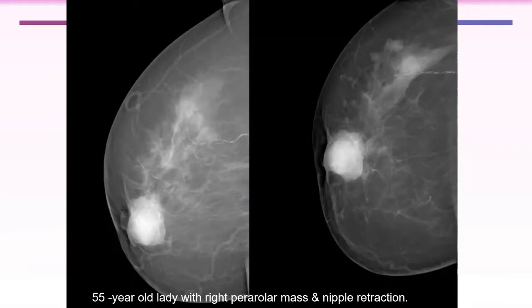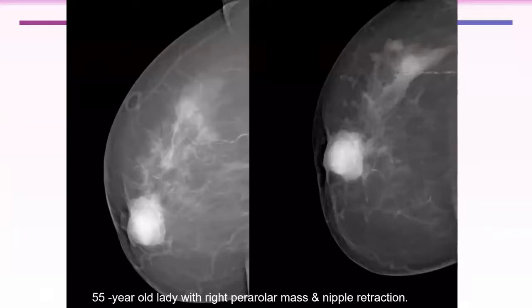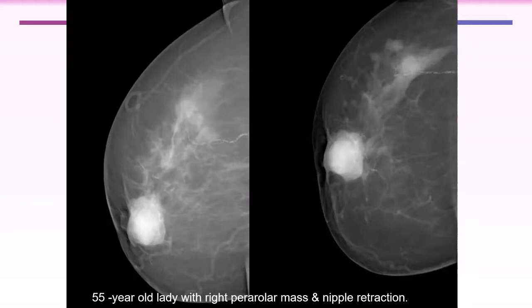Only inverted, or is there some thickening? Associated thickening and retraction at the area of the areola only.